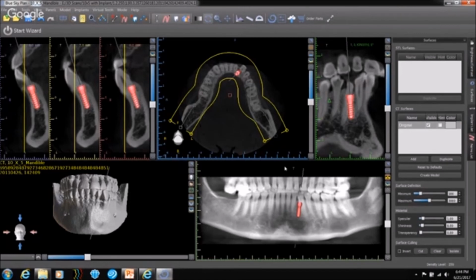So there's a huge advantage when it comes to resolution of the images by keeping the images at a slightly moderate resolution. One of the biggest advantages, if you have any restorations like this, you see over here. In this case, the resolution was kept to a very modest extent, so that there's not much scatter or noise in the image coming from these restorations.